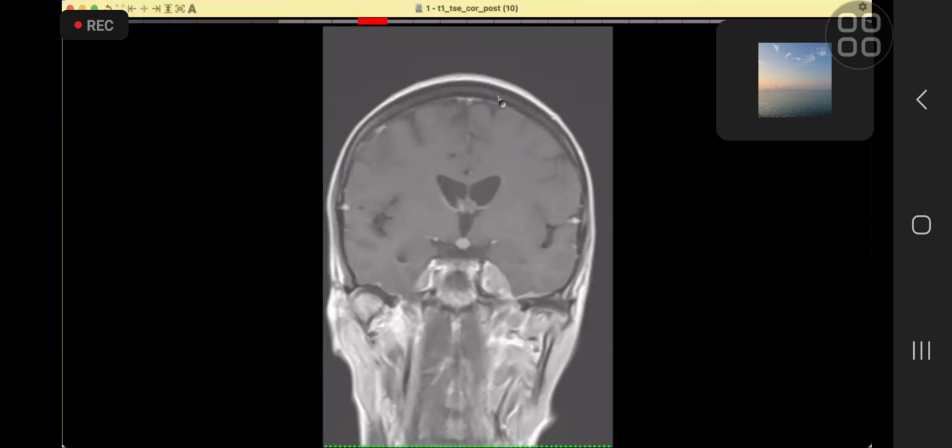However, I'd like to confirm in the MRA images or CTA. The second differential diagnosis will be an enhancing lesion like an optic pathway glioma. The others are unlikely, like craniopharyngioma.